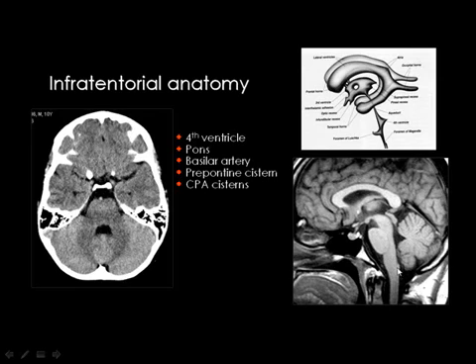If you look at this MR image, you can see this is the brain tissue, this is the cerebellum, and this is the brainstem. The fourth ventricle is located between the cerebellum and the brainstem. It is big in its middle part, and becomes smaller lower down, and also smaller in the upper sections.